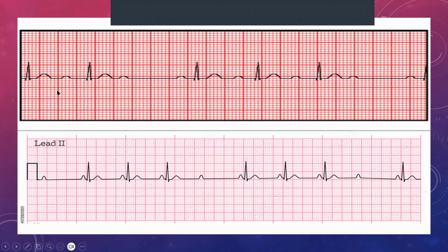So let's have a look at the two side to side. So again, if we look at our Mobitz type 1, let's start from here. So here we can see our PR interval. It's about, let's say, a full block, more or less, about 5 mini blocks. Here we can see it elongates to about 7, and here we can see it elongates to almost 8, and then you get a drop. Your QRS complexes in a Mobitz type 1 are always narrow. You will never get a wide complex QRS in a Mobitz type 1.